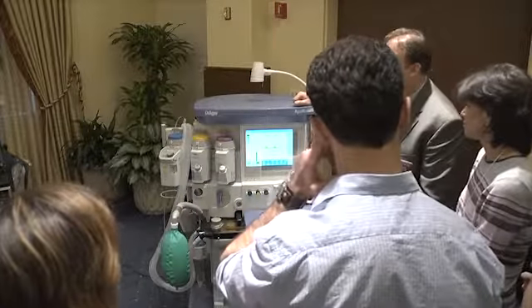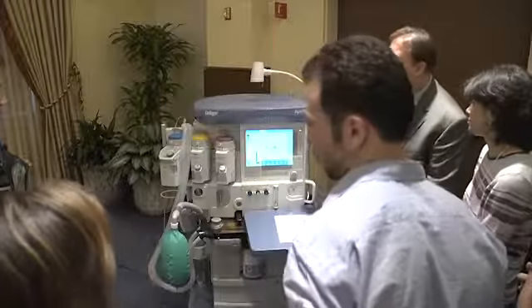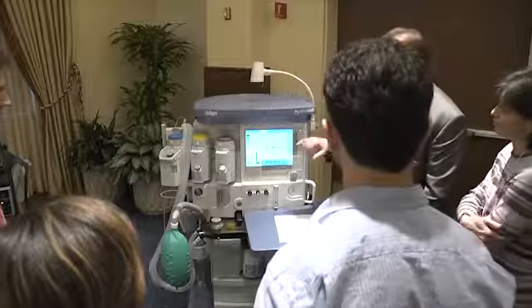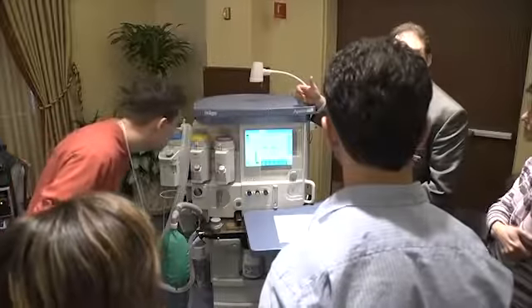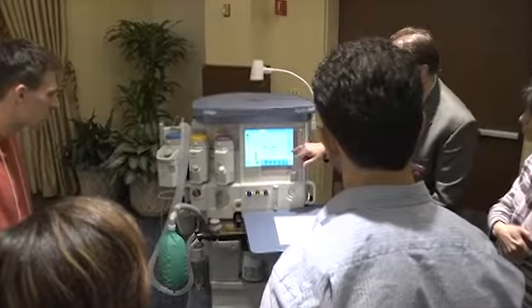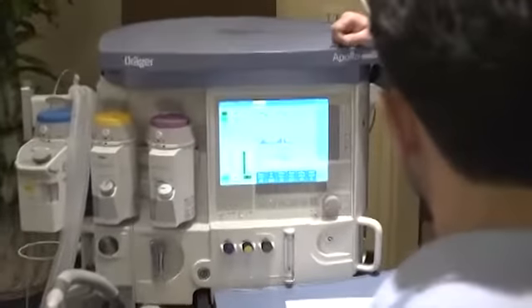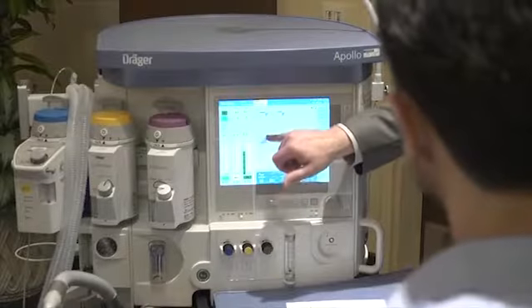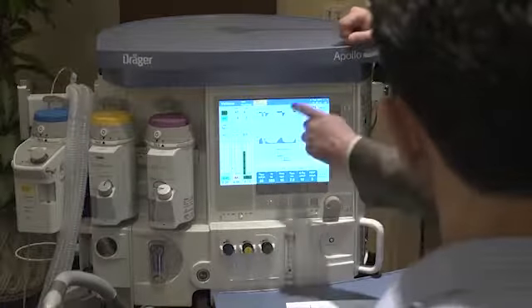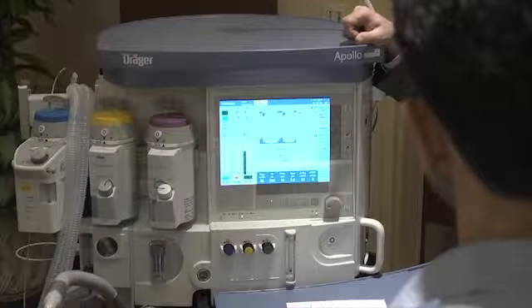We also have the apnea pressure alarm. That apnea pressure alarm is the dashed line that we see across the screen. Typically its default is 8 centimeters of water pressure. I've moved it up in order to achieve an alarm situation, and you can see we have our apnea pressure alarm. When the ventilator is on, our pressure waveform has to cross that threshold every 15 seconds or we'll get an apnea pressure alarm.